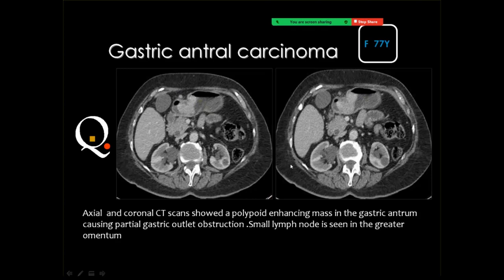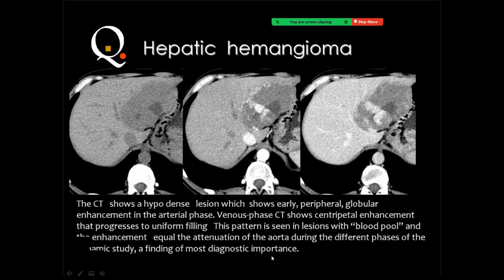This is one of the drawbacks of arterial phase imaging, where you cannot see the parenchyma of the kidney. You see only the cortex, and the pyramids are not yet stained with contrast material. Then this is a parapelvic simple cyst. It is not a dilated renal pelvis.